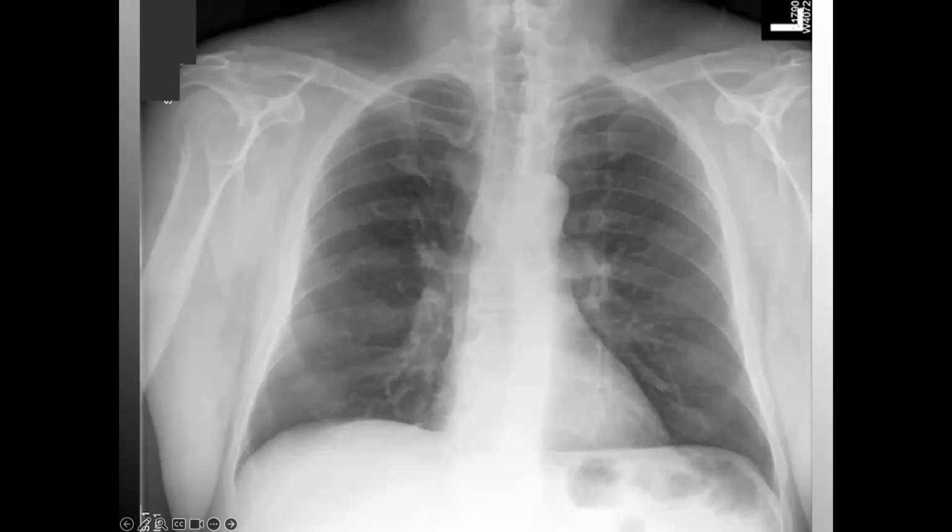Now, some of you on the call say, well, I see some fluid overloading beginning to start, maybe some infiltrates, but recall that when you have a flattening of the diaphragm on the non-liver side, and this patient has no history of COPD, hyperinflation, or air trapping, most likely this is nearer to a mid-inspiratory film, not quite full expiratory or full inspiratory. We've got doming of this side and kind of flattening of this side. So it's difficult to say unless you're there when the X-ray is shot. We're talking about seconds of time, but probably this is a PA X-ray.